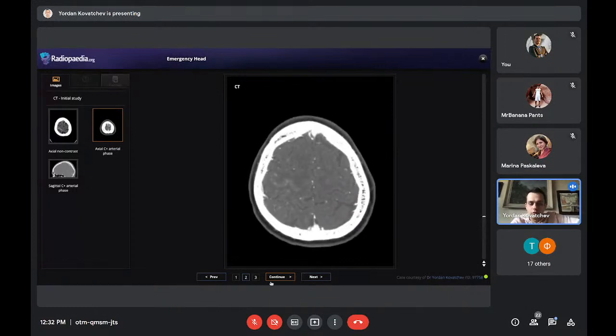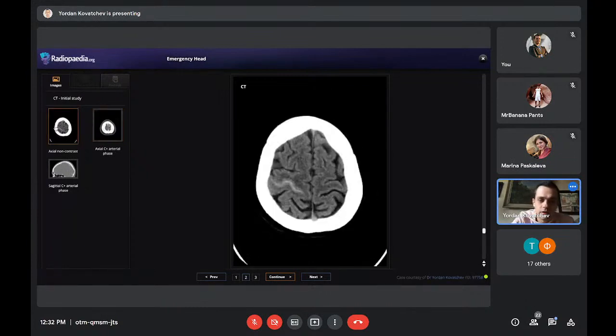And it's a really important case, because this means that the vasogenic edema actually correlates to venous infarction. And this is how it presents, with vasogenic edema, compared to arterial infarction, where you have cytotoxic edema, loss of gray-white matter differentiation. Here we have vasogenic edema.